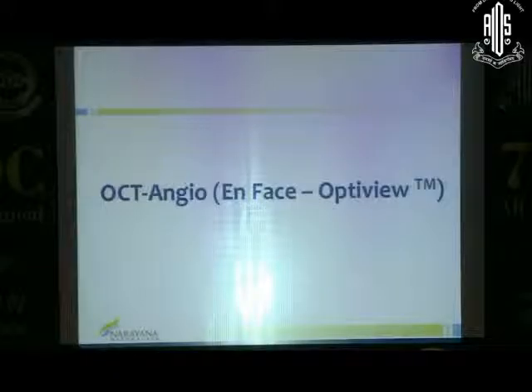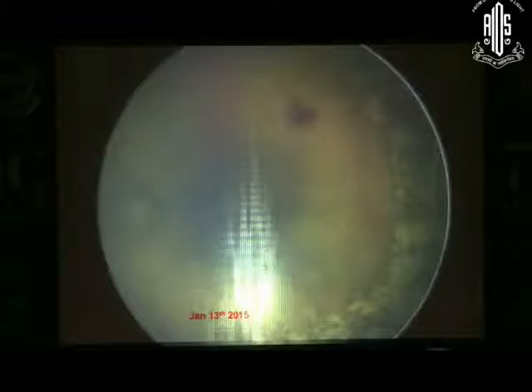Now, OCT angio, a very, very early experience, just 2 or 3 weeks in our institute. I put these images more to learn from the audience than to actually share something new. This was a case that has been lasered, and we want to go closer. We understand there's some ischemia, and we're wondering how close to go, because the fovea is still not fully developed.